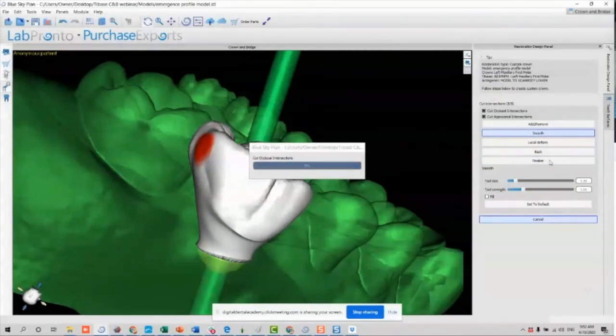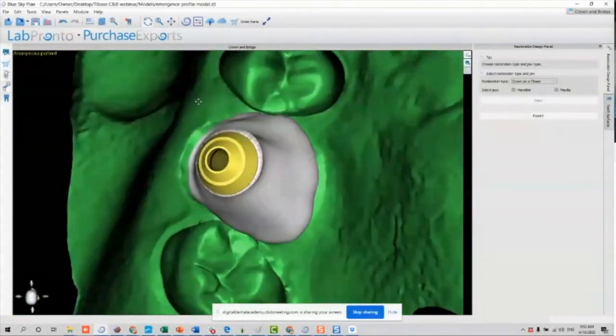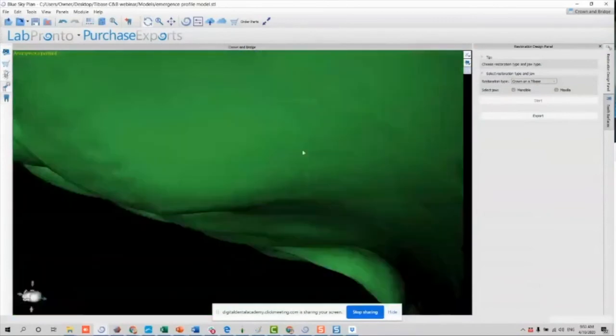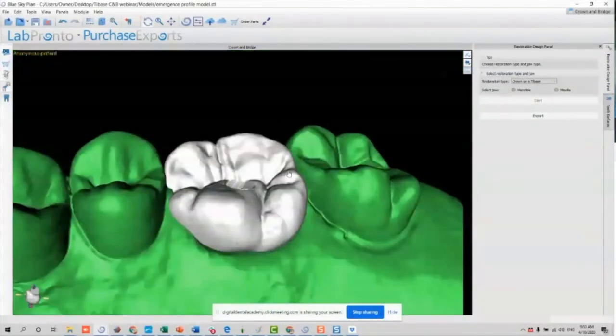and this will start creating our temporary. So now at this point in time, we have a temporary crown for our implant restoration, okay? The software, as you can see, trimmed all the models. It trimmed the models in the interproximal surface, and it also trimmed the occlusal surface automatically. So you will never have these tight contact areas at this point in time.